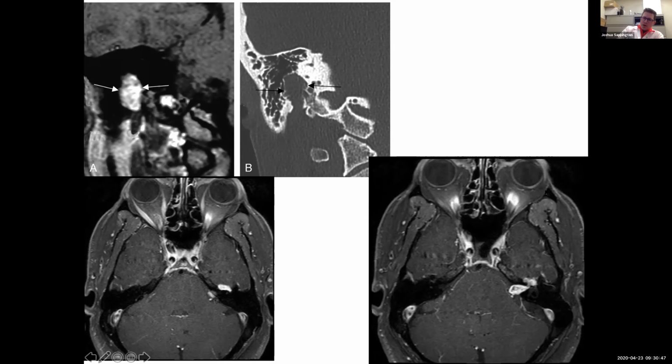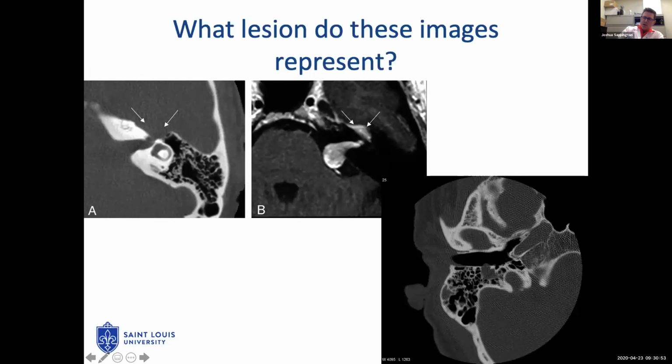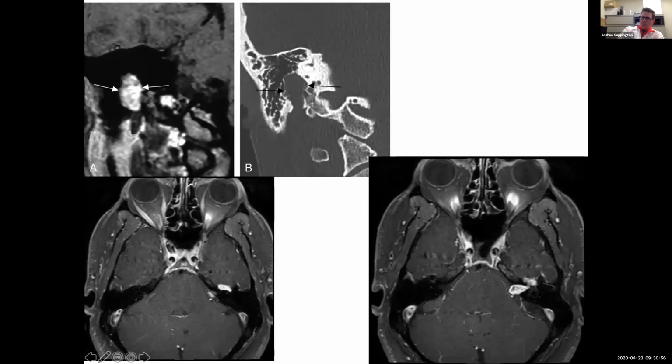One of the key points that I will bring up is a situation like this, and then a situation like this. Now, if we have to operate on a facial neuroma, we want to have a nerve-to-nerve link up. If this is growing into the brainstem, the issue is that if you have to operate on that patient, there's not going to be anything here. And so you start getting into things like 5/7s, 12/7s, cross facials. In monitoring patients, that's just a key element to take a look at.